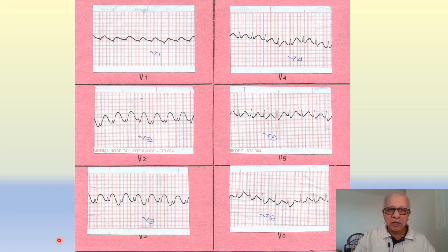It looks suspicious, if you look at this ECG, especially if you are seeing only lead V1 or V2 without being given V5, V6, you may even mistake this for a ventricular tachycardia. So you have to be careful. What you are seeing here is not the QRS, it is actually the ST-T, which is so prominent, whereas the QRS is very tiny, seen in between these two waves, right? So don't mistake it for a ventricular tachycardia.